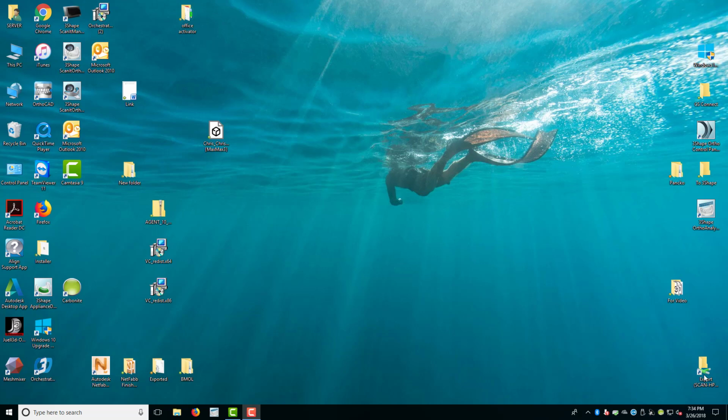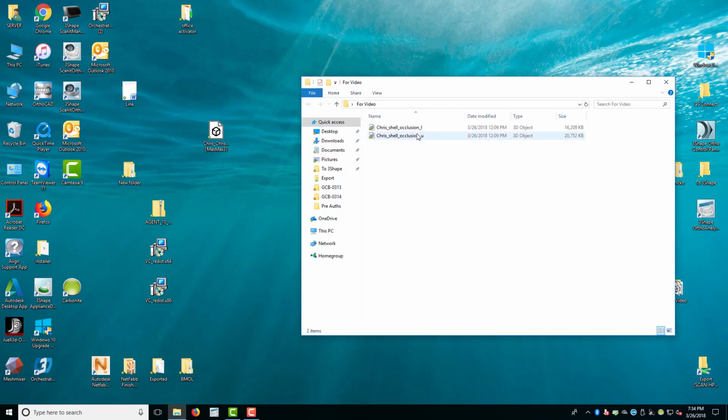And here we are again, trying to show how to prep scans, and I actually have scans this time for the printer using 3Shape. As you can see here, I got my scans. So the first thing that I have to do is open up the 3Shape.